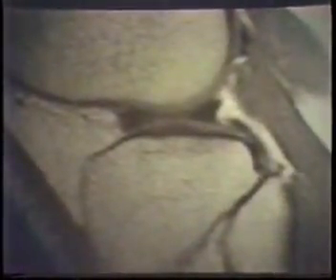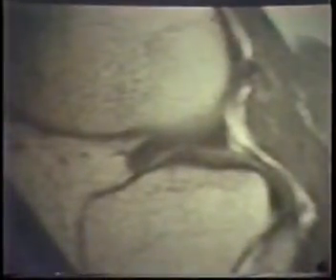The importance in these is to determine whether they're torn or not. Most of the discoid menisci we have seen have been asymptomatic, and they've been in knees that have had medial meniscal tears. In that situation, the arthroscopist would like to know of the existence of a lateral discoid and also know whether it's intact or not. Most surgeons these days will not operate on a discoid meniscus unless it's torn. They'll take care of the medial side, look at the lateral side, and leave it at that.